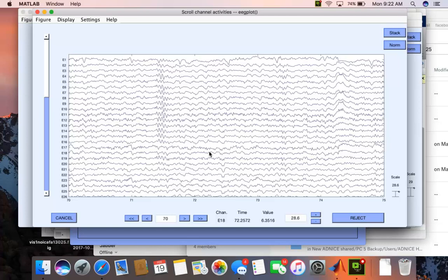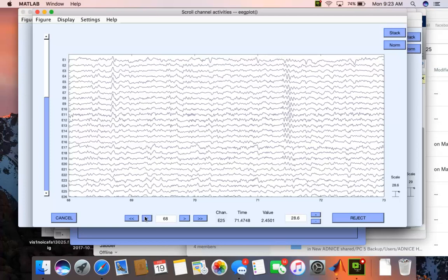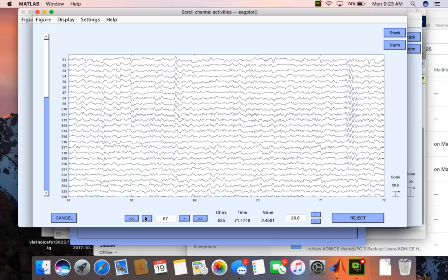Then we'll ask them to do things like answer questions or respond to sounds, or do something that requires that they are cognitively engaged, and we'll look at the difference. So that's kind of part of the clustering or pattern recognition part of what we do. But the signal processing part of what we do, usually we will pre-process our data by doing some filtering, and then we'll begin our work, because filtering is pretty fundamental. I mean, you saw I have some off-the-shelf software here that does a pretty good job. We'll begin our work then with a data file that looks like this.